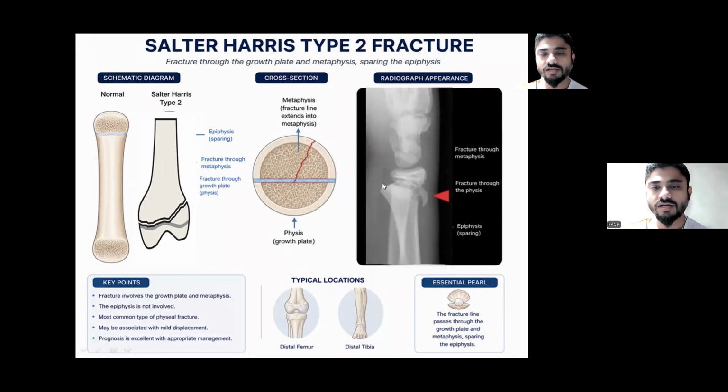And as you can see there is a fracture line. There is uncovering of this growth plate. That means the fracture line is running across the growth plate and extending along the dorsum aspect of the radius. That is why this bony fragment of the distal end of the metaphysis is separated from the parent bone. So this is Salter-Harris type 2 fracture.